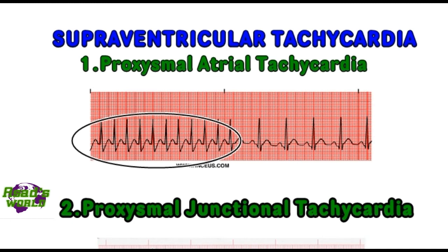Now moving forward to paroxysmal atrial tachycardia, you can see the graph. You can see that in one part of the ECG strip the heartbeat is very fast and in the later part it has a very slow heartbeat. So it shows that it is paroxysmal, that it begins or ends abruptly, and the other part is normal. Now the atrial rate during atrial tachycardia is usually around 100 to 200 beats per minute. So this actually causes a narrow complex with a P wave that has a slightly different morphology, which you can see compared to normal. You can see the P wave in the paroxysmal atrial tachycardia and the normal part.